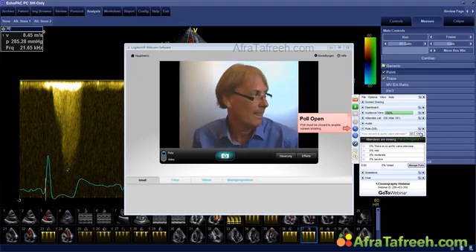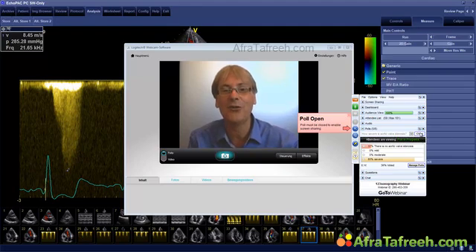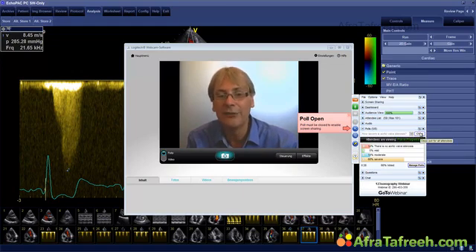Amjad asked if there is aortic regurgitation as well. We'll see if aortic regurgitation is present. I noticed that he seems to know what he is doing, because obviously he knows that the additional presence of aortic regurgitation affects the gradients. But just based on this spectrum, I would like you to answer the question. This is a very difficult question, I must agree, but I want to help you focus on a very interesting fact that you can see within the spectrum.